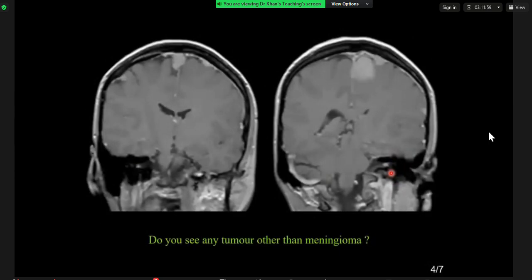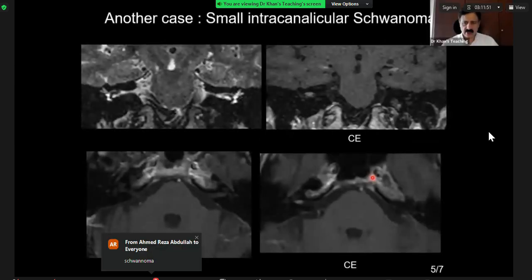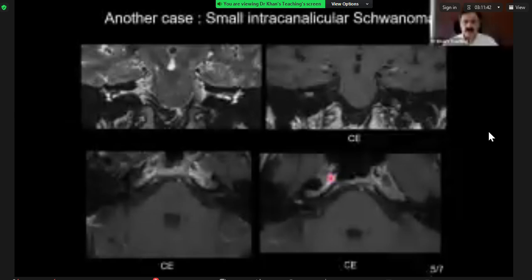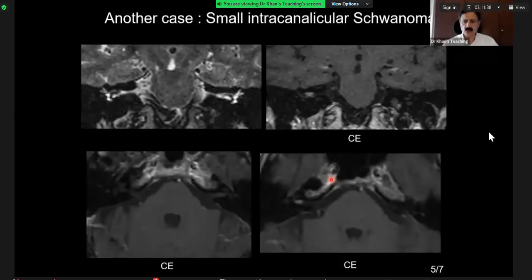So these can be vestibular schwannomas. Okay, very good, very good. We'll come back to your case. Now, I think it is too harsh for me to just show you that post-contrast sequence with normal field of view and expect you to pick up the acoustic schwannoma.